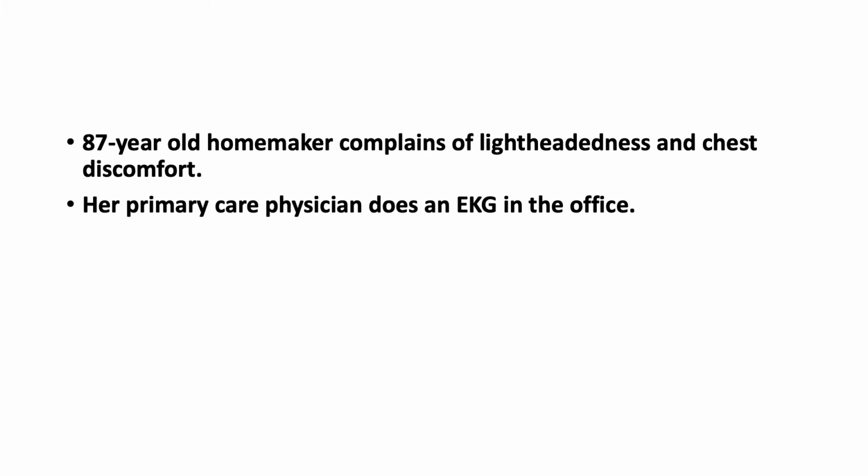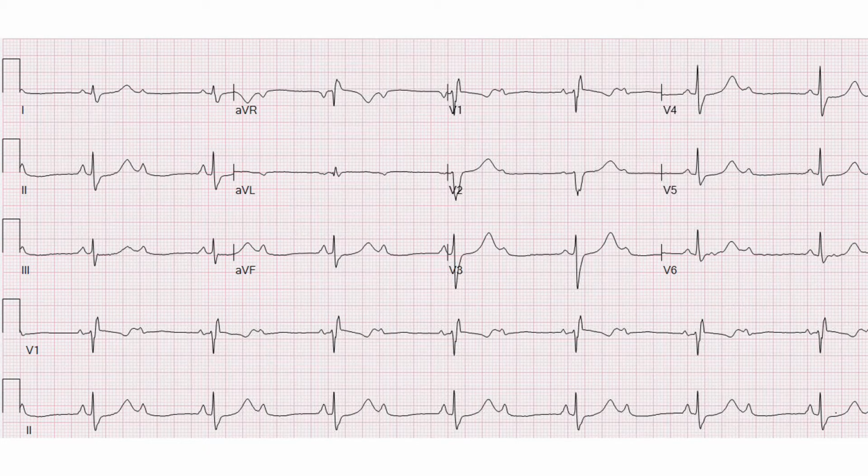A 87-year-old homemaker complains of lightheadedness and chest discomfort. Her primary care physician does an EKG in the office, and the EKG looks like this.